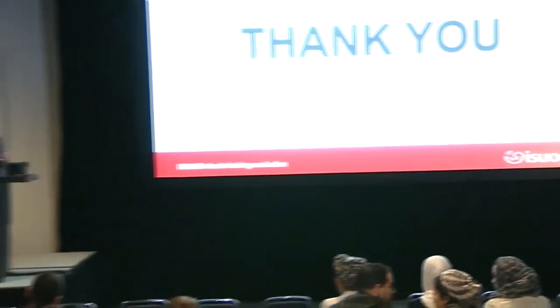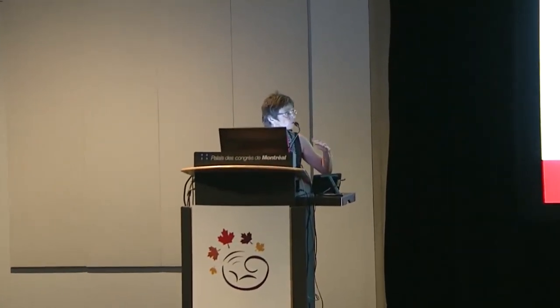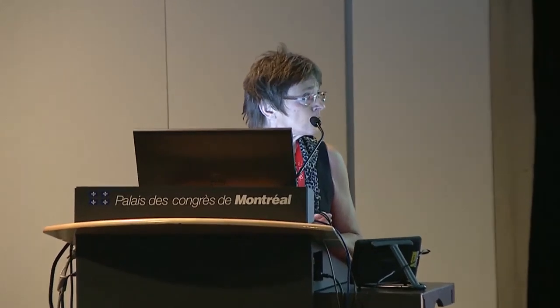There is a question online from the center of Alexandria, Egypt. They're asking about the significance of the sliding and mobility of the structures during transvaginal examination and if they can predict adhesions. Yes, as I mentioned earlier this morning, the beauty of vaginal ultrasound is that we can assess mobility, and if when we push upon the organs with the vaginal probe or with our free hand, the organs don't slide, this is a sign of adhesions. So it's definitely possible and important to do it.